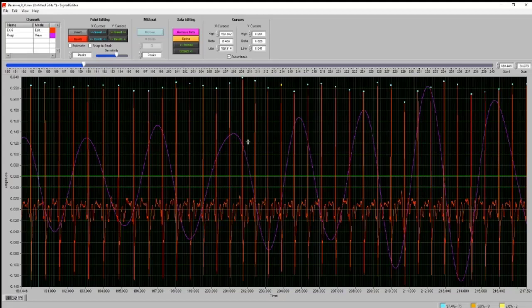So if this beat right here, if this interval is extremely long, this actually makes a lot of sense to me, because they were breathing out. Let's say that this respiration was 2 or 3 times its amplitude. Well, that might cause enough to result in one of those changing in that pace.